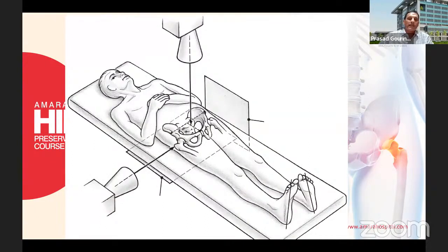This is a supine X-ray being taken. There's a specific tube to image distance and all that, but those are not as important as getting the entire pelvis with no obliquity, not too much tilt, and no rotation when we take the X-ray. And the feet are internally rotated.